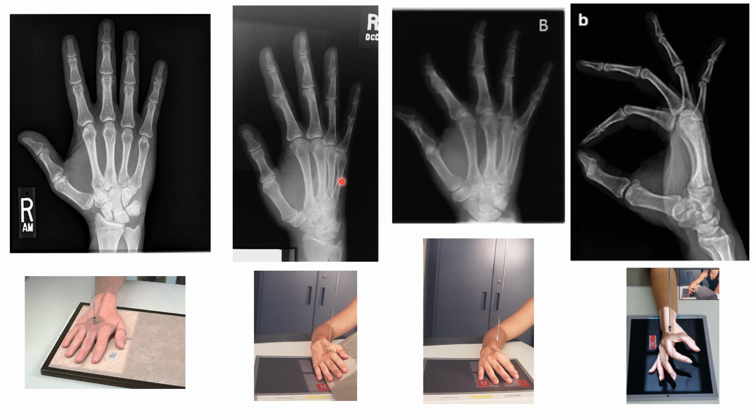We can see a difference if we compare this oblique with the oblique next to it. We can definitely see a difference in the rotation of the hand, because by judging how close these metacarpals are, the third, the fourth, and the fifth, and then measuring the distance between the second and the third and the fourth and the fifth, we see a little bit of insufficient rotation happening here because of the separation between the third and the fourth metacarpal.